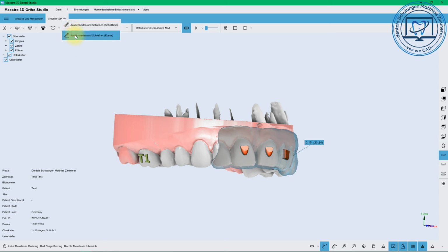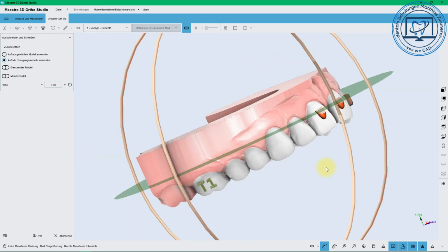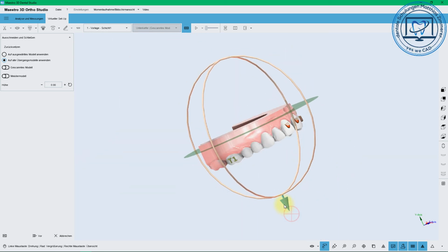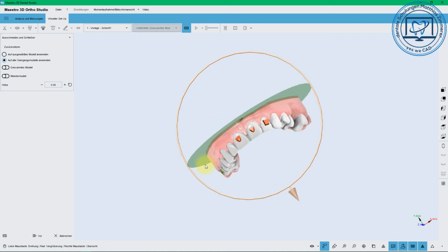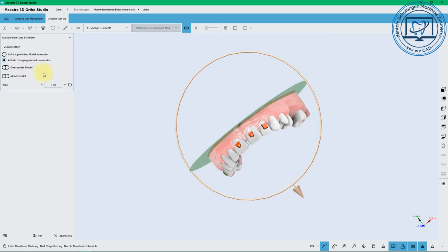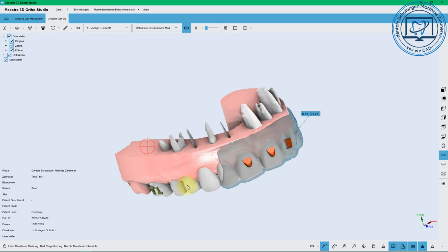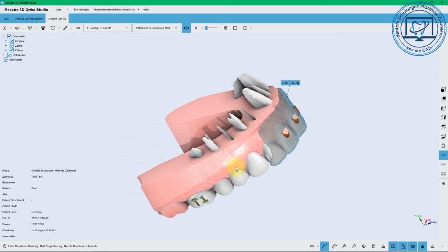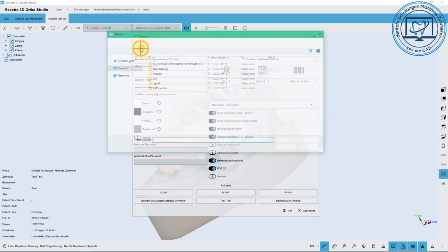This is the second option you can do. If you say now it's too high, you can now cut it easily. If the jaw is complete, I think this isn't the best solution. It doesn't work the whole time. But if it's plain cut and you say the models are too high, then you can make it a little lower. At the last, we would get the report.